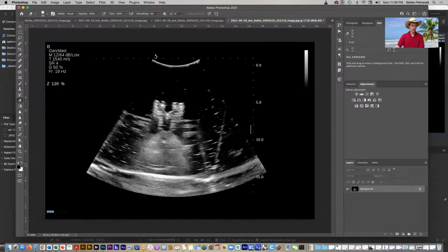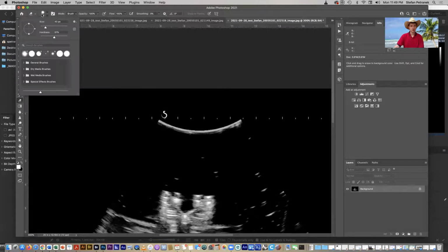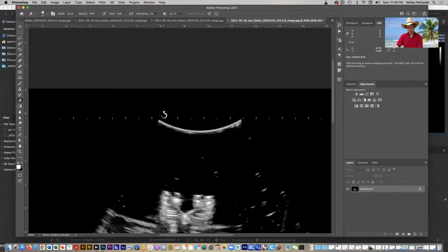So this actually shows you, if you have black in the background, then since all these images start out as pure black, the way they come out of the machine, you can just erase parts of the image that you're not interested in, like this. So if you didn't like this S up here, you found that difficult, you can get rid of it. Remember, the eraser has a size too. So you can adjust that up here, and you'll find all its subtle different variations of that tool up at the top. You can adjust the size to your liking, like this.